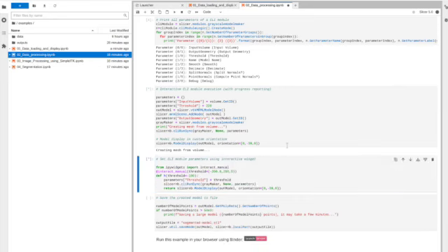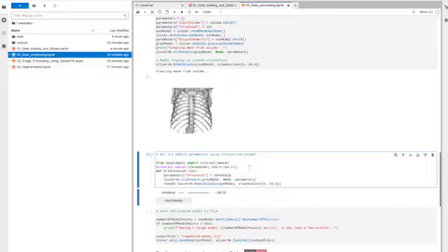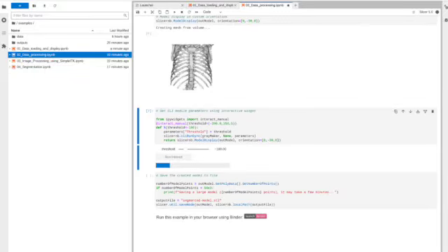That's why it's taking a little bit, but it's actually going to show us a 3D rendering of the chest cavity, and also essentially 2 points in the chest cavity. So if you wanted to find not only the tumor volume or the distance, but the distance of 2 points in the chest cavity. Let's see if this actually loads it up.